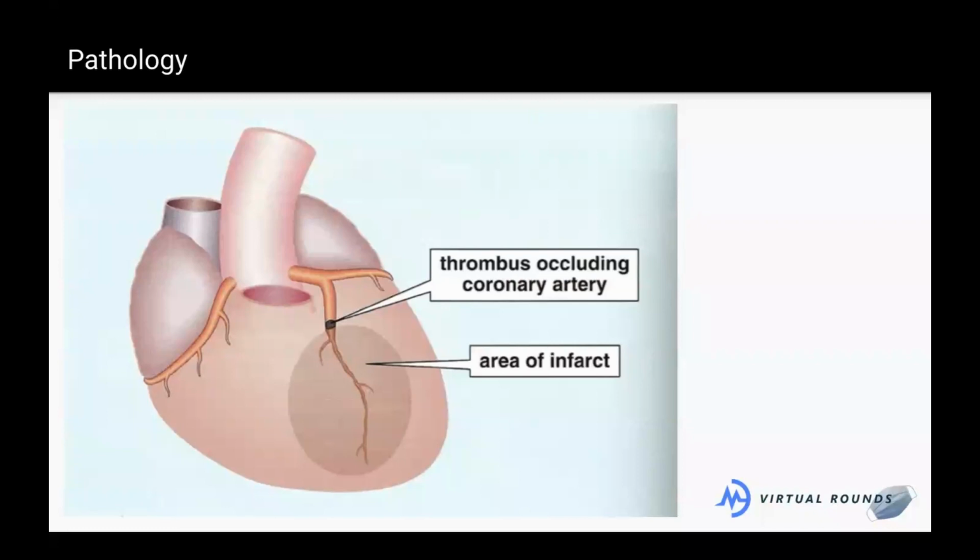We talked about the QRS complex, that's our S, and then the T is that little bump that comes right after the QRS complex. That's where the ventricles are resetting themselves to get ready again to contract. If that segment is physically up, it's elevated, then that's a STEMI.